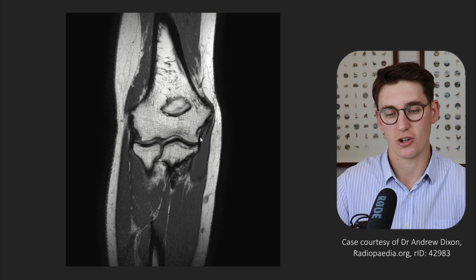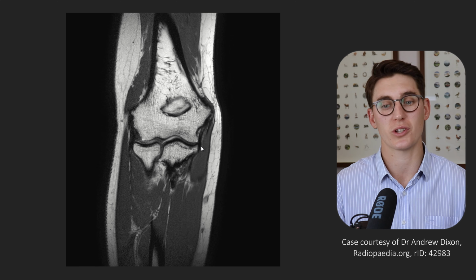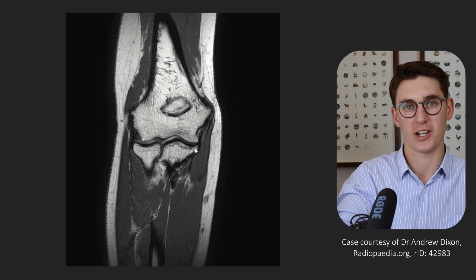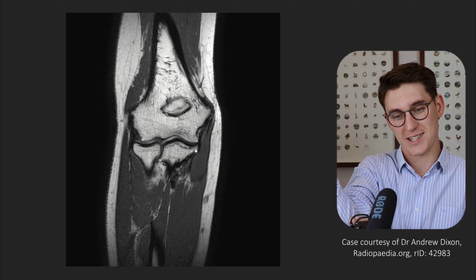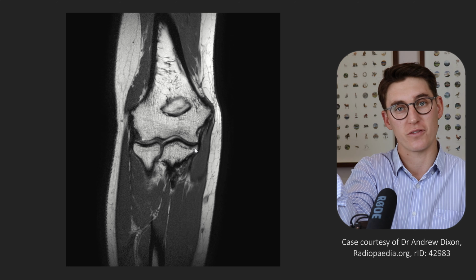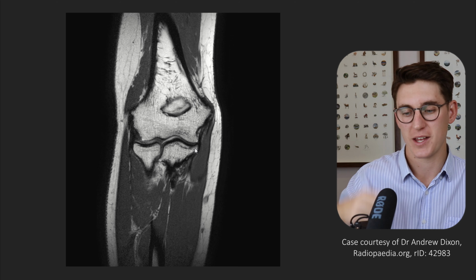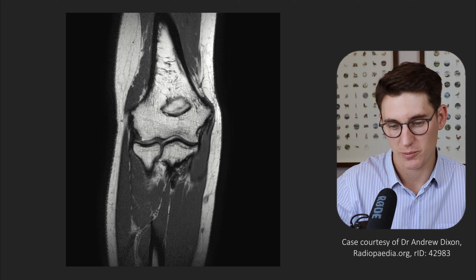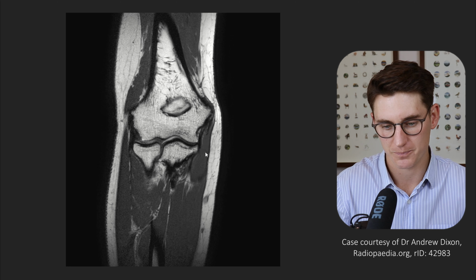The largest part of the ulnar collateral ligament is this anterior band, and it's the one that we're going to be looking at most when we're assessing for injuries. If you've got people who are throwing a lot and they're giving a lot of valgus pressure on that elbow, it's this ligament that experiences a lot of the force coming through it. Baseball players or cricketers that are throwing like that, they get lateral compressive symptoms on this side, and then we get tears in the anterior band of our ulnar collateral ligament on this side.